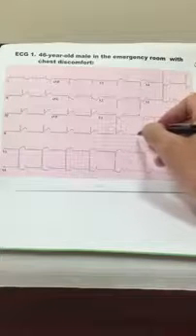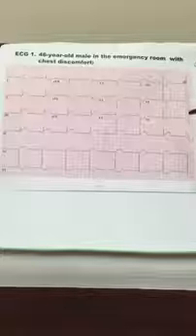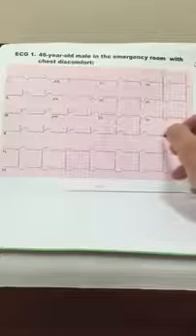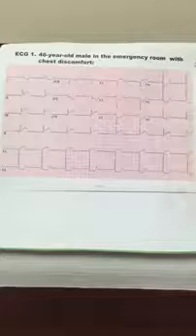And for that, you'll find a P wave that's usually wider than normal. And so normal is about 0.08 to 0.1 seconds. Okay, so that'll be less than 3 small boxes wide. So if you have a P wave that's more than 3 small boxes wide, then that would be a sign of P mitrale. And in this case, the width is about 2 small boxes. So once again, these P waves are within normal limits.